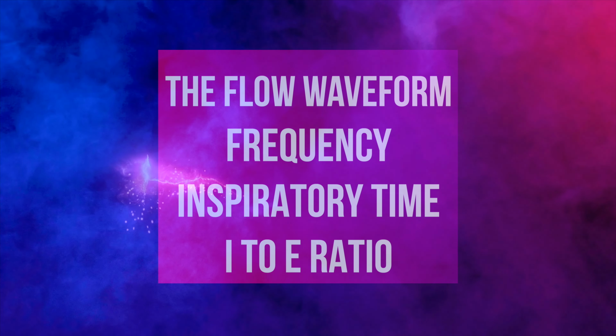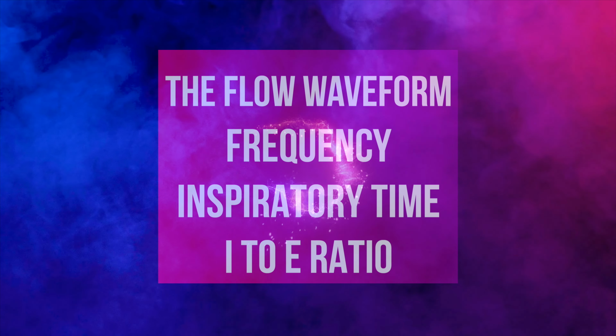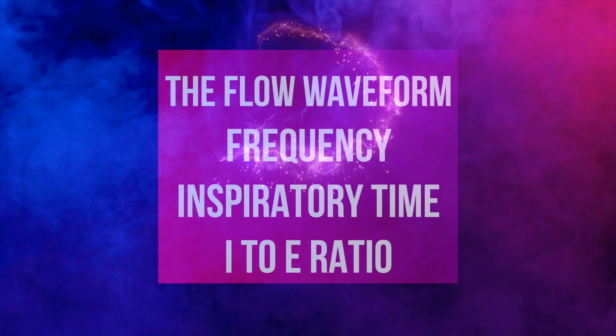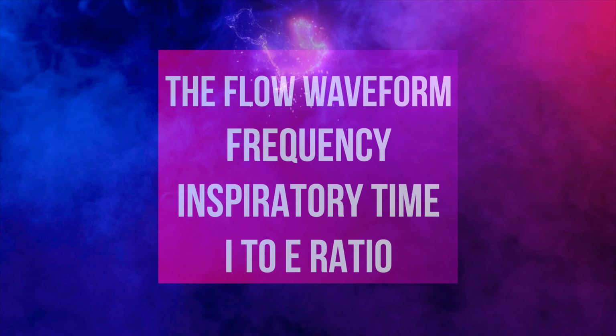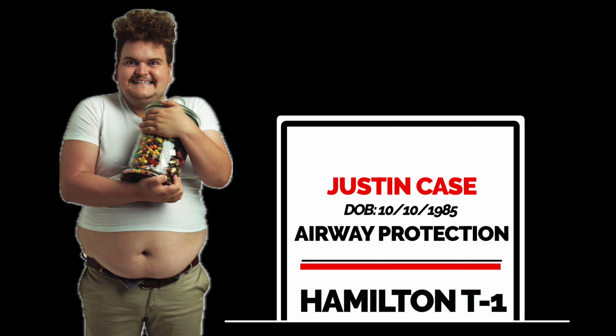In this module, it is crucial to understand the flow waveform, its relationship to frequency, inspiratory time, and the inspiratory to expiratory ratio. Here is our patient just in case. He requires intubation for airway protection, and fortunately, we have a mechanical ventilator that will provide feedback on his ventilation status.